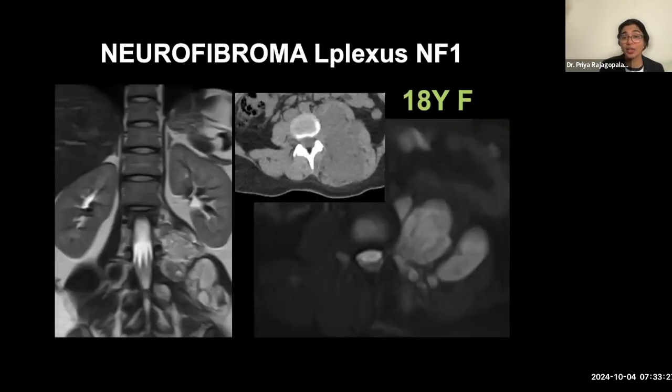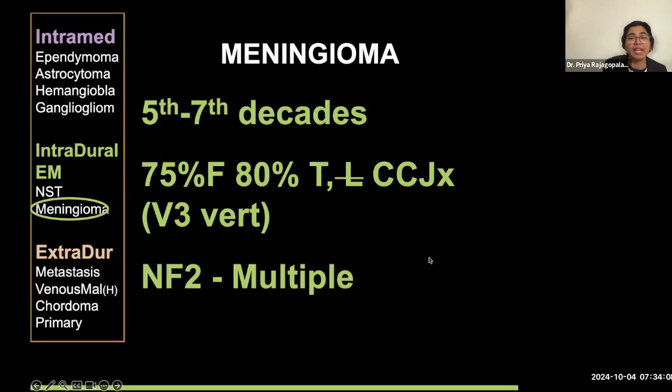Okay, so here's one along the lumbosacral plexus. As you can see here on the left-hand side, the patient's left side, radiological right, is this big, complex, lobulated tumor that's arising from the nerve sheaths of multiple of these lumbosacral nerve roots forming the lumbosacral plexus. And so that has insinuated into the psoas muscle, into the posterior paraspinal muscles, like it's that big tumor. And here's an MRI showing the same thing. It's a T2 bright tumor that's insinuated itself into the muscles adjacent to it, and the tumor itself centered in the lumbar plexus.